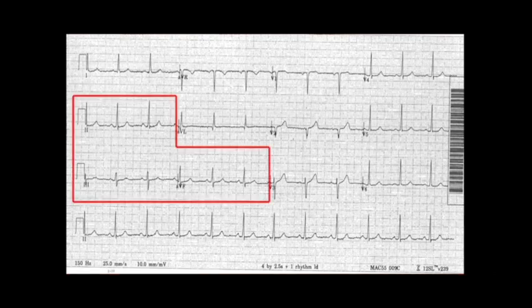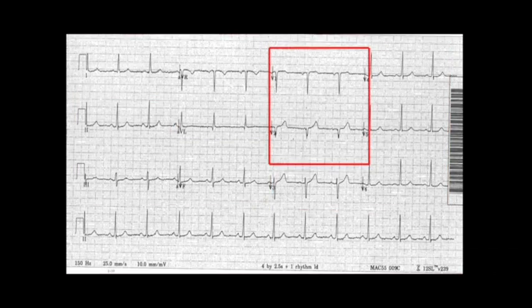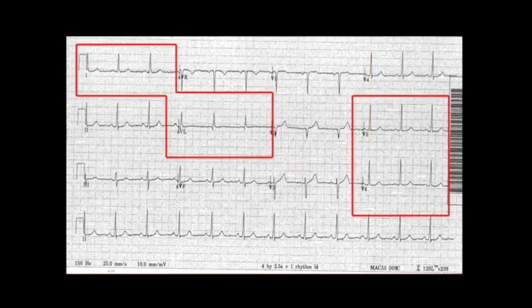Look at leads 2, 3, and AVF together. Look at leads V1 through V6 together, but then look at V1 and V2. Then look at V5, V6, 1, and AVL together.